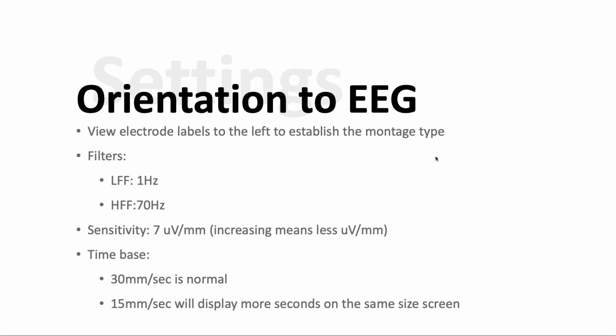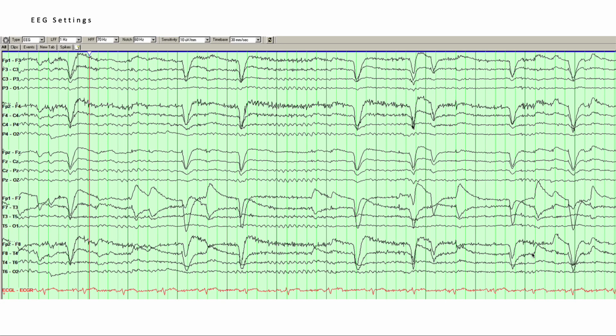I'll go through this more with you when we actually look at EEGs, but just understand these basic settings for now and try to commit these to memory as you look at several EEGs, and get a sense of the normal settings to have something to reference back to.